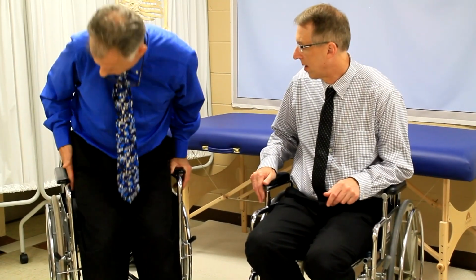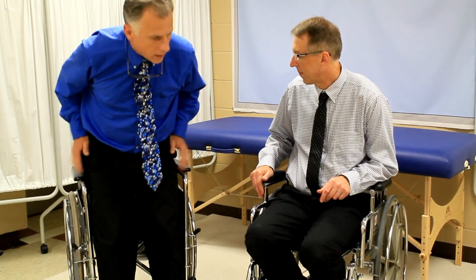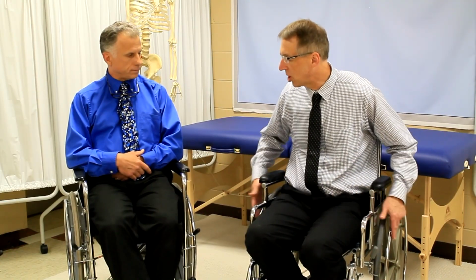I can put a few fingers here and a few fingers here, and that's pretty much my rule of thumb so that you don't get stuck. I've had people where the chair is too narrow and they squeeze into it and it causes circulation problems, skin breakdown, uncomfortable. And really you want it as narrow as possible with it still fitting, because the wider a chair is, the tougher it is to get through doors.